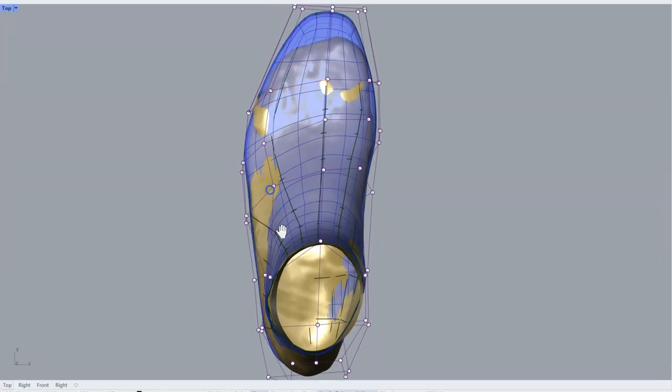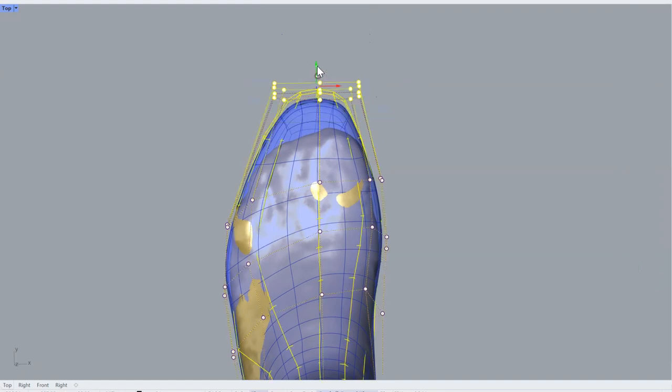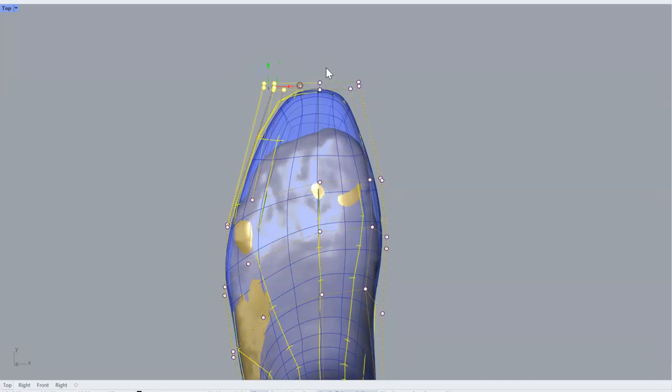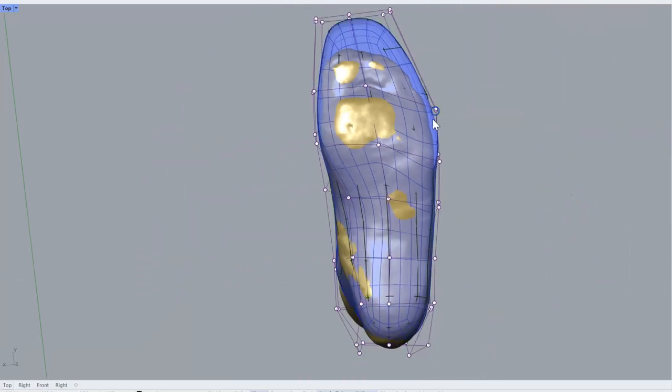You see there's not enough room for the toe in my opinion, especially for an orthopedic last. It also depends on what type of shoe you want to make. Will I make a dress shoe or a worker's boot? You need more space, of course. Okay, this comes close enough.